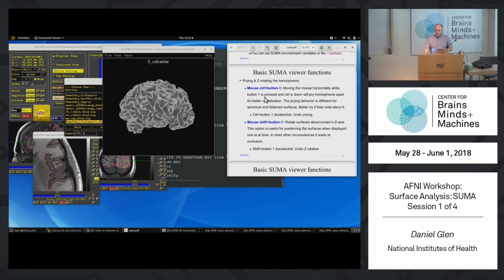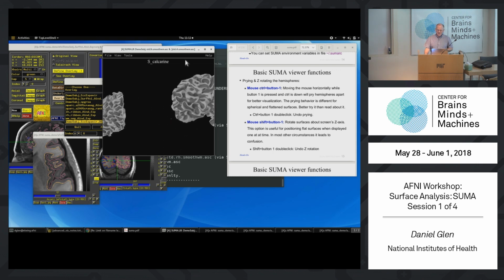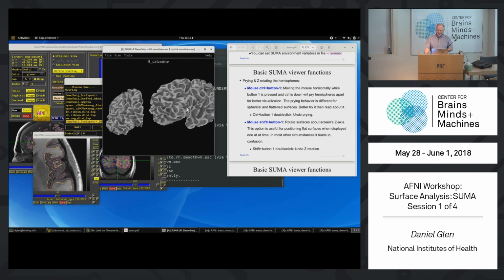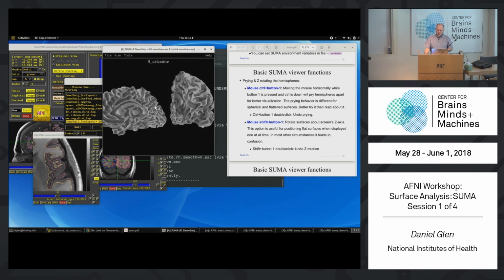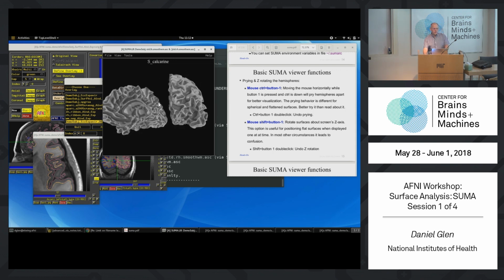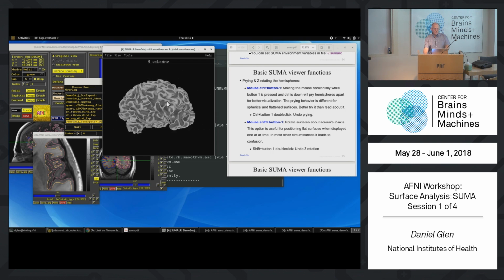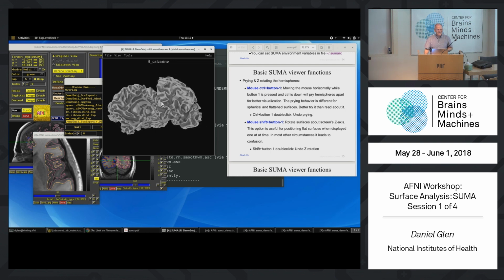Okay, so mouse control button 1. We're going to do control and hold the same left button down. I think everyone will like this. Ooh. So you can have them applaud. How did you do that? Control and the left mouse button. Yay.